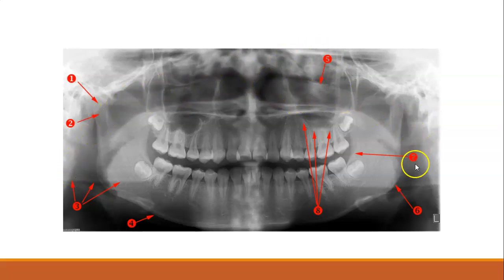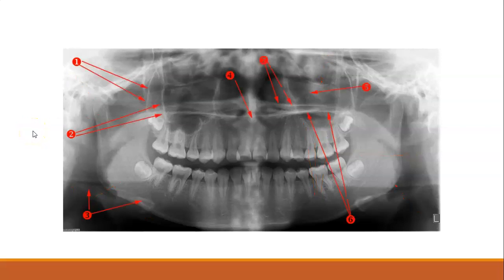You can see this big air space, that double air space here, and then down into here. You can see the mandibular fossa. Try and see if you can pick out things that aren't even labeled in all these various panos. So let's go to the next one.